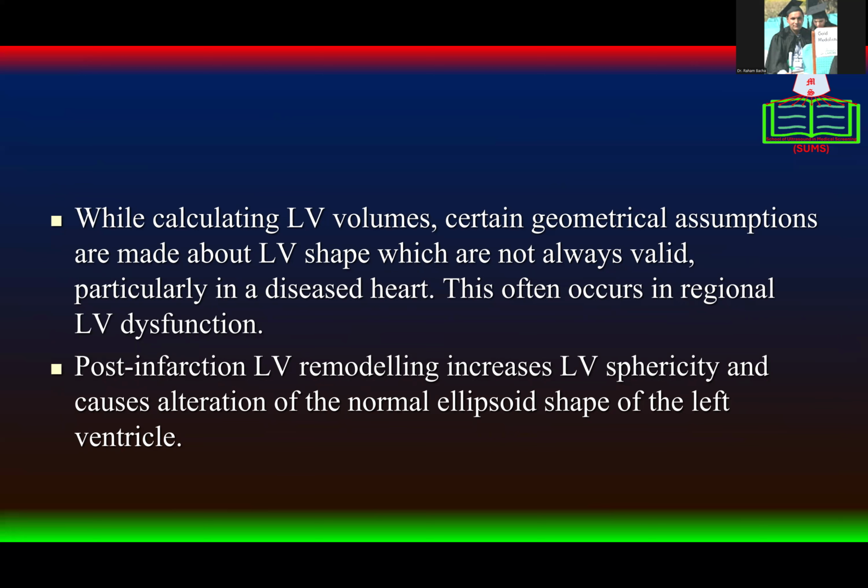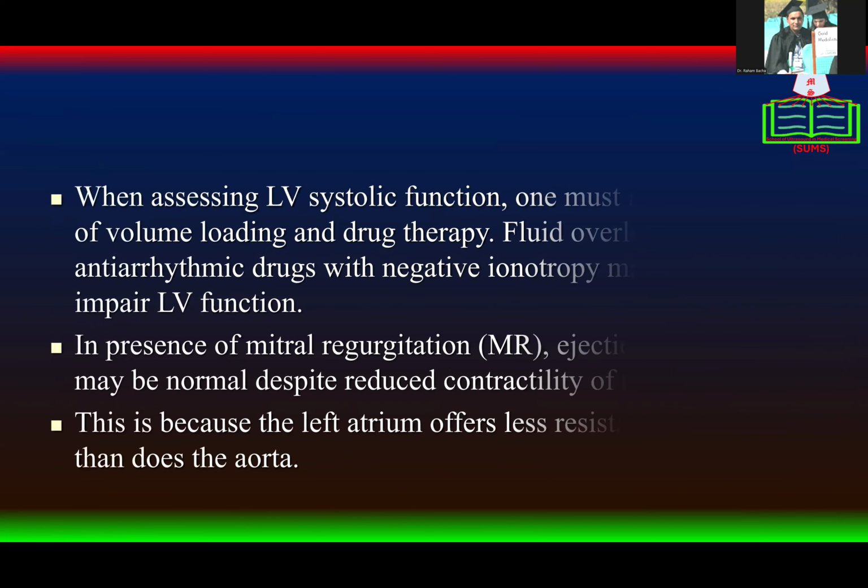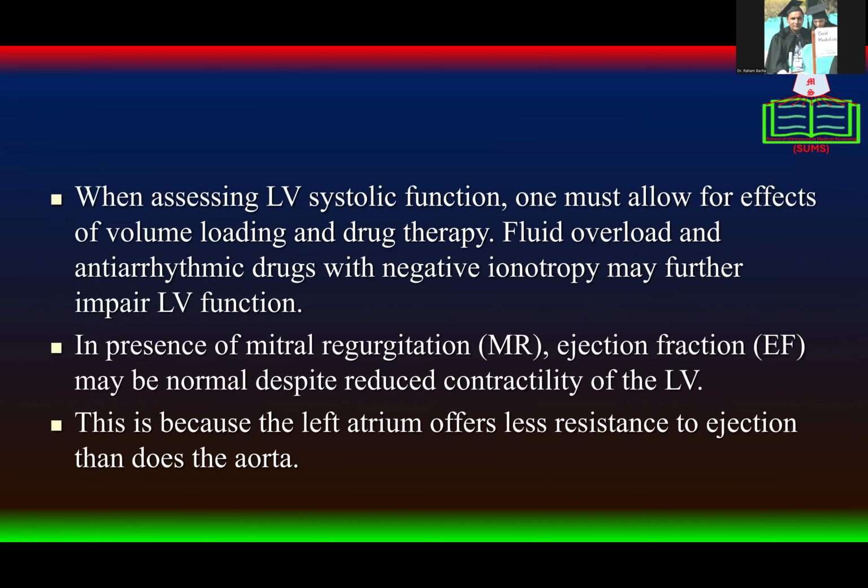This often occurs in regional left ventricular dysfunction. Post infarction, left ventricular remodeling increases left ventricular sphericity and causes alteration of the normal ellipsoid shape of the left ventricle.